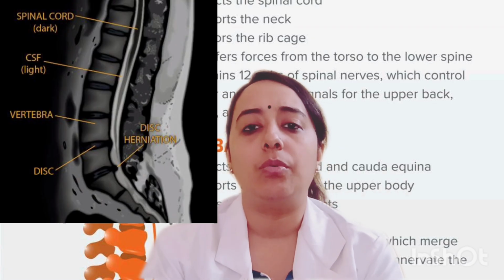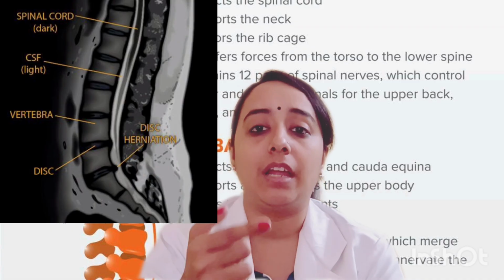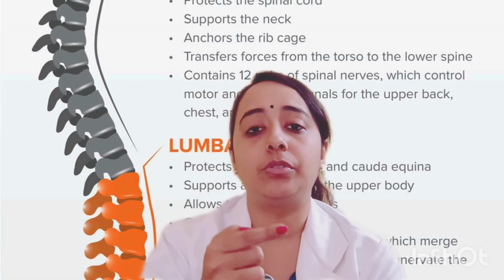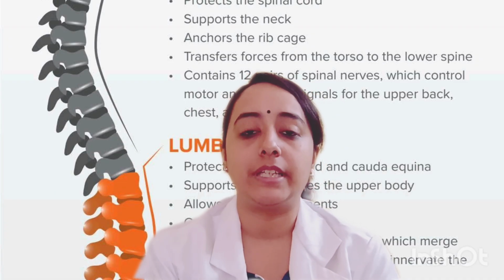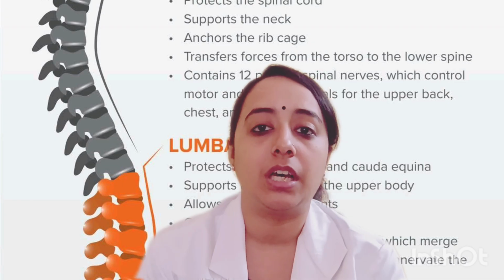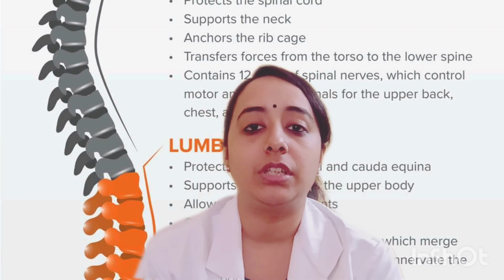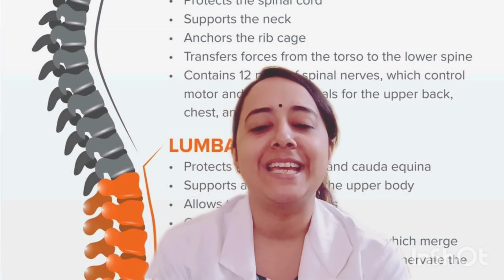Now the bottom part from that, actually that's the spinal cord, within the spinal canal, which we say. When it comes down to the lower part, it becomes like spinal nerves. That is where our nerves are getting connected to our spinal cord. Now behind that are the bones. I'll be posting another video where I can show you with an actual demo piece. Right now just get along with this.